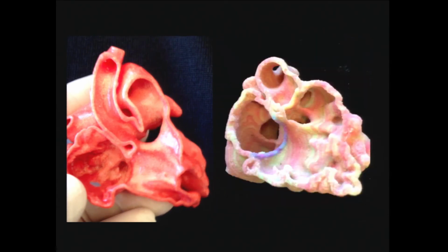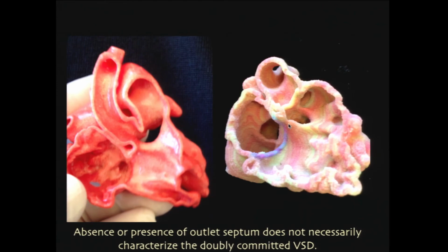Otherwise, this is another case. This is the right atrium, right ventricle. You have the aortic valve and pulmonary valve. Actually, there is no infundibular septum. However, the VSD is not doubly committed. The VSD is below the aortic valve only. Which means that presence or absence of infundibular septum is usually in concordance with doubly committed or non-doubly committed VSD, but not necessarily. Absence or presence of outlet septum does not necessarily characterize a doubly committed VSD. That is an important thing that you should remember.